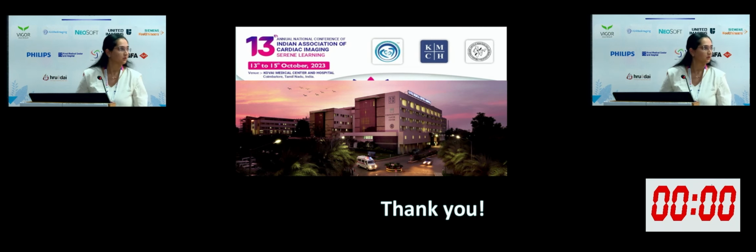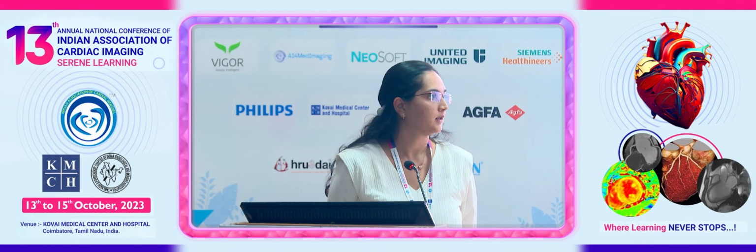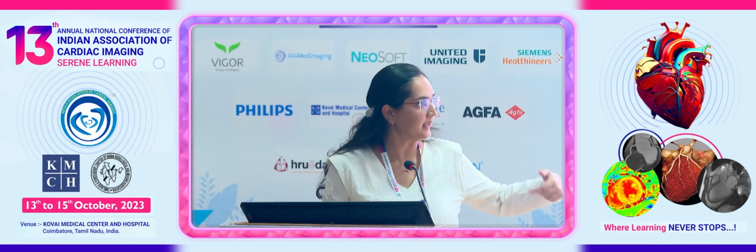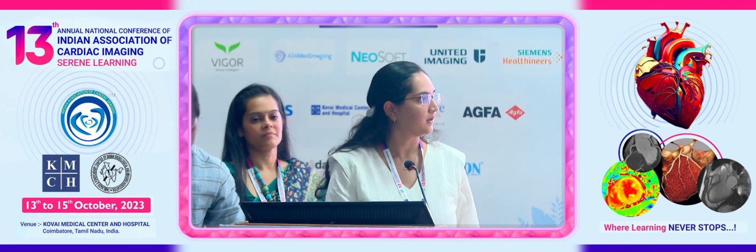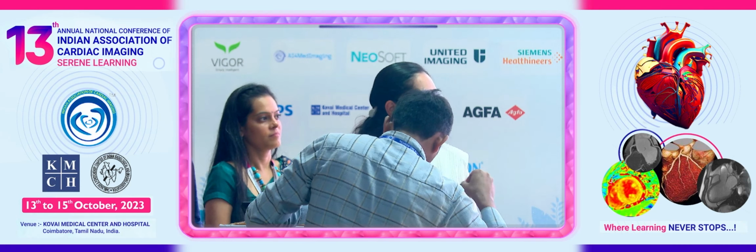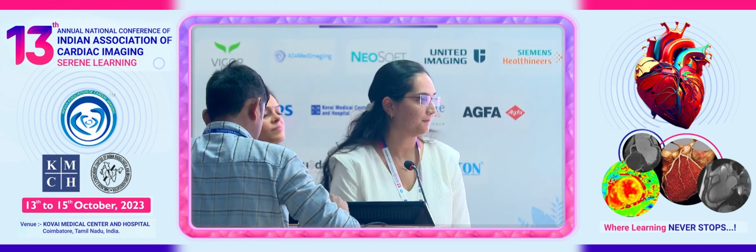I think most likely the thrombus formed in the aneurysm itself, and then it dislodged and went into the posterolateral branch. So it had to travel retrogradely first into the PDA. No, not retrogradely. It went in a way retrogradely, but because the flow in the coronary artery is directly from the RCA approximately distally, that led into the posterolateral branch. Most likely.